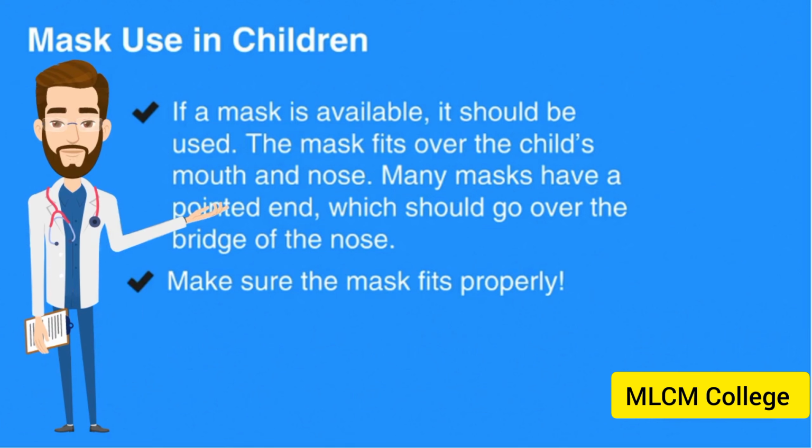Mask use in children. Giving breaths in CPR is generally safe. However, if a mask is available, it should be used. The mask fits over the child's mouth and nose. Many masks have a pointed end, which should go over the bridge of the nose. Make sure the mask fits properly. If it's too large, a proper seal cannot be obtained and efforts to deliver breaths will be ineffective.